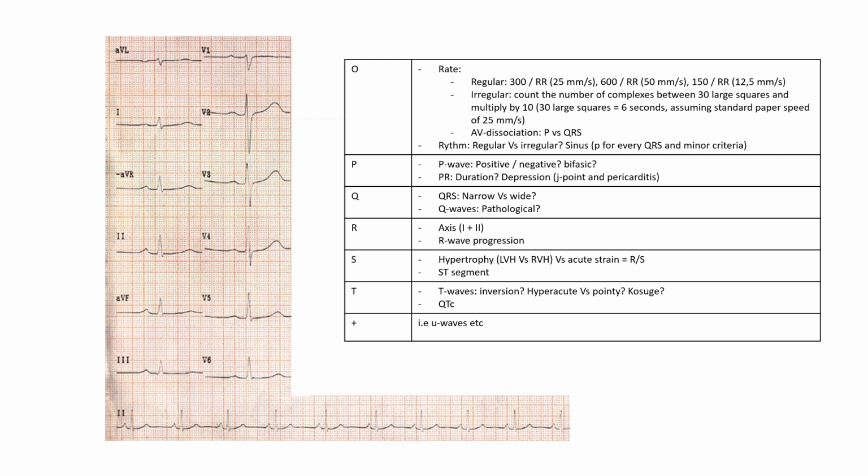All right, then we look at the T waves. And the T waves, I forgot to mention, should always be concordant to the QRS. So if the QRS is dominantly upwards, then they should always be upwards. And negative T's are usually seen sometimes in lead 3 at baseline. There are some places where there might be an inversion that is within normal variation. But as a general rule, the T wave should be in the same direction as the brunt of the QRS complex.